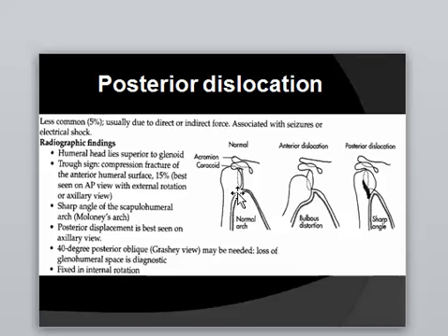It is usually superimposed on the glenoid, like this one, and the trough sign is the erosion or fracture or avulsion of the anterior part of the humerus. This one is anterior dislocation. It is down and inferior and anterior. So downward displacement is usually anterior, upward and posterior displacement usually seen as superimposed on the glenoid.